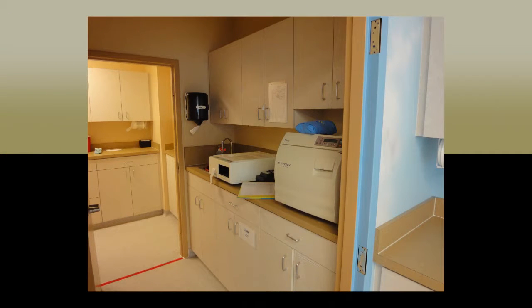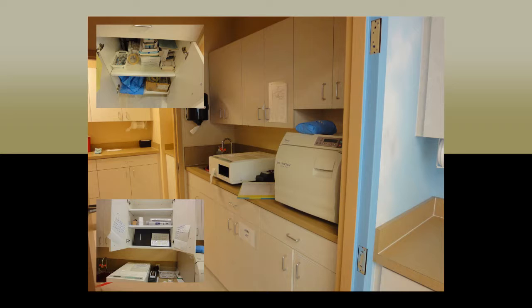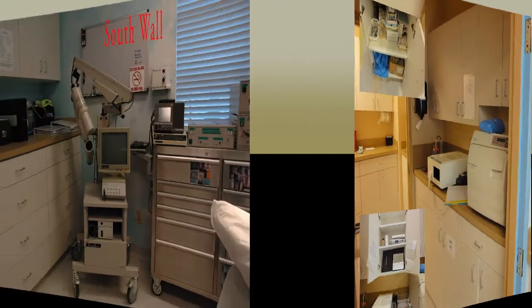The small extension of the operating room, located next to the nurse's station on the north wall of the operating room, is where the sterilization equipment is located. Within the drawers and cabinets are supplies used in the sterilization process. Sterilization paper and tape, as well as sterile indicators, are located in the drawers and cabinets below the autoclaves, while the cabinets above house all sterilization logs and spore test logs, as well as surgical scrubs. For education on the use of the autoclave, see the staff training video under the sterilization section.